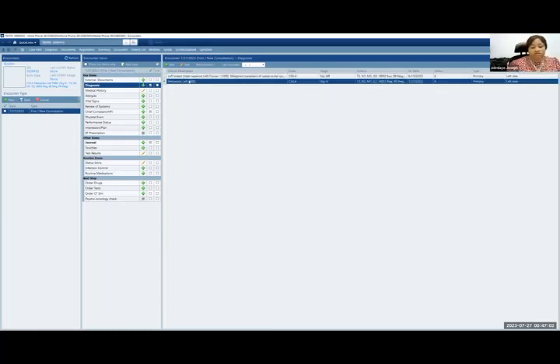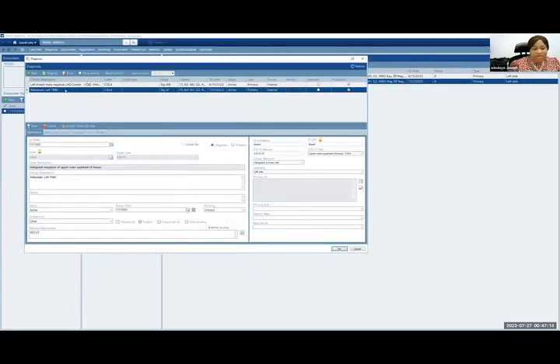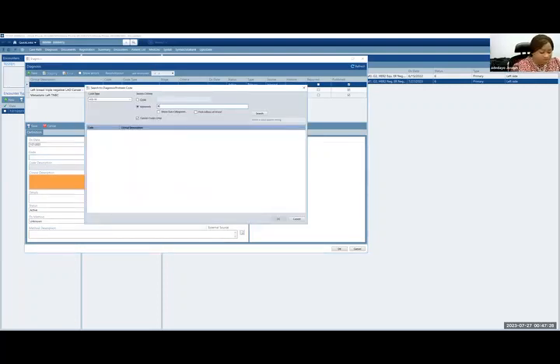But what I wanted to show here with the metastatic left breast CA, so let's edit this, is that I want to show how to connect a metastatic lesion to the primary lesion. So this is the breast lesion now. We are going to add brain. So she has metastasis to the brain. So again, diagnostic date is today. And we're going to add the code for brain. So this is brain.